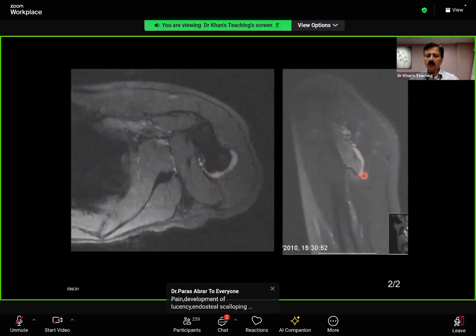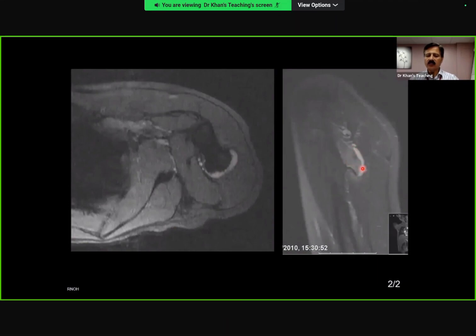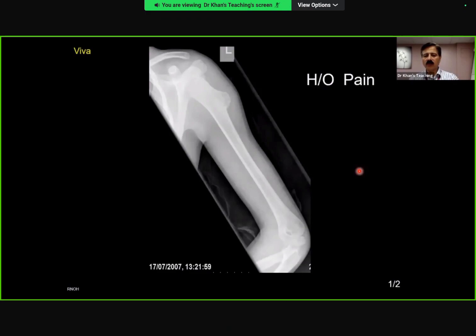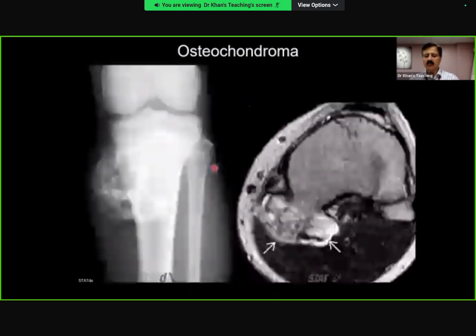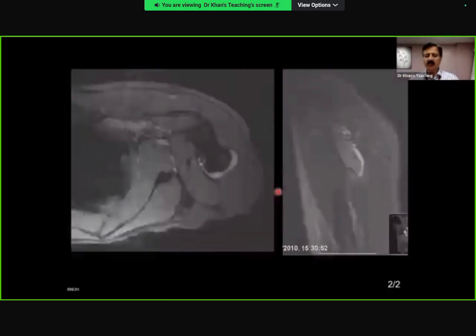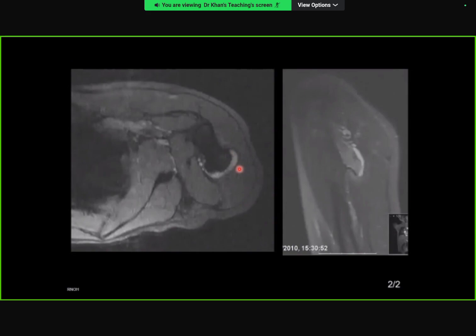And we are talking about thickness, this and this. This axis we are not bothered. Thickness, the bone is here and this is the cap. So if I go back and you see this is the cap. So we are just talking about the thickness, and this thickness is less than 2 centimeters. 1 centimeter. Yeah, and this is a benign lesion, so there is no malignant transformation.